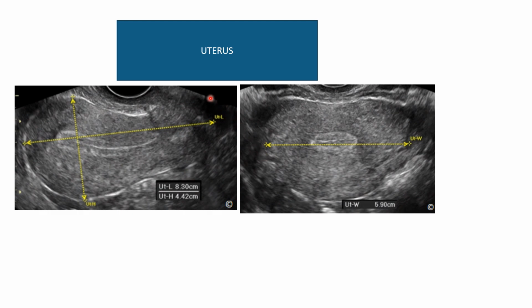However, you don't start with a transvaginal, you start with a transabdominal ultrasound scan and assess all the adnexial regions. Or there could be masses, fibroids which are too big that you can miss on a transvaginal ultrasound, because a transvaginal ultrasound probe is a high frequency transducer with a very limited field of view.